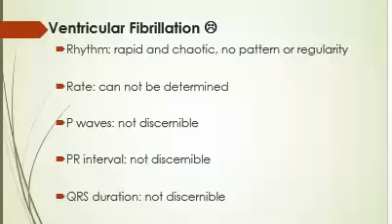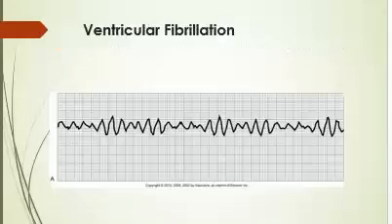We have to, as nurses, be able to identify this and know exactly what to do. Let's look at it and see how it looks. Yep, looks like your little kid trying to write in cursive. Exactly. The catch is there is electrical activity, and we need to move really quick before there is no electrical activity. There is no contraction. There is no cardiac output. The patient is unresponsive. The patient is pulseless. The patient is apneic. The patient is dead, basically.